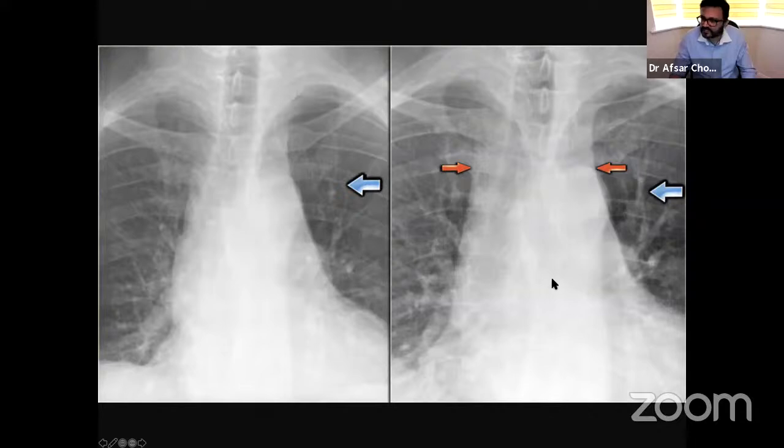The first stage, the redistribution, is where you start seeing the dilated vessels in the upper lobe. That is called cephalization. You won't normally see big vessels going up. When you start seeing that, it is a sign of redistribution in a patient where you are clinically suspecting pulmonary edema. The vascular pedicle, which we described earlier for dissection, gets widened and responds to the fluid status.